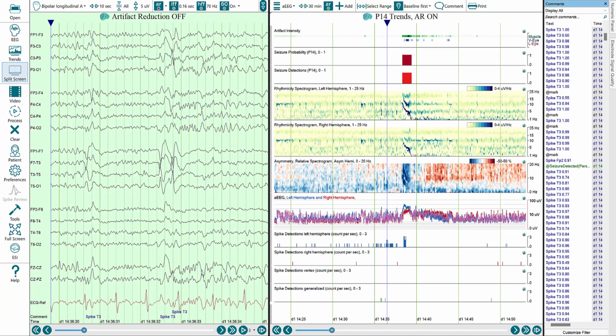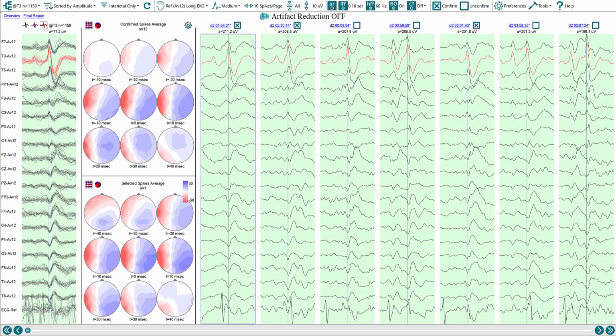all within Spike Review. My name is Michael Guess, and I am the VP of Research and Clinical Applications for Persyst Development, and this screencast will be much more of an overview of the new tools rather than a case study. And so, the example we'll be using for our brief overview is a straightforward one. It's a 24-hour recording with spikes that are primarily occurring during sleep. And here's a quick peek of the new Spike Review.